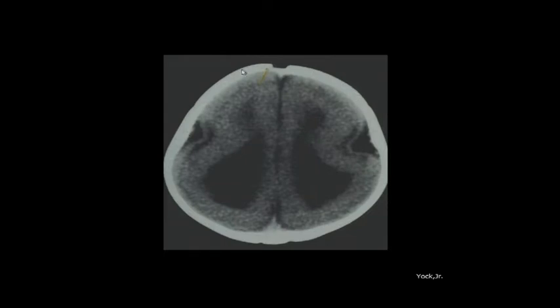This is a different patient. We see this sometimes on a neonatal ultrasound, but we can't call it if the kid's less than 28 weeks gestational age because sulci usually don't start forming until about 28 weeks. But this is a smooth brain. It's like a figure of 8 brain. It's called what? Lissencephaly, smooth brain.